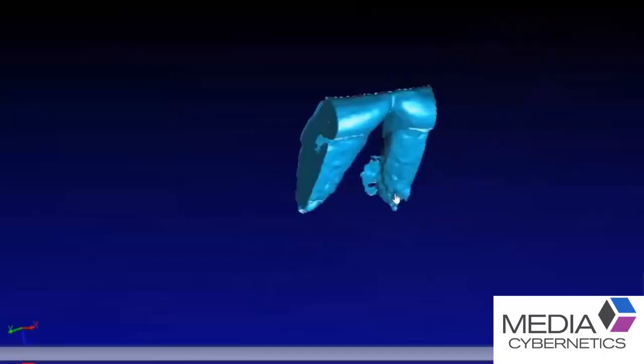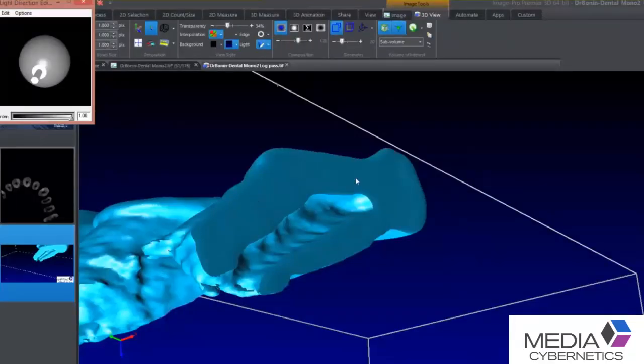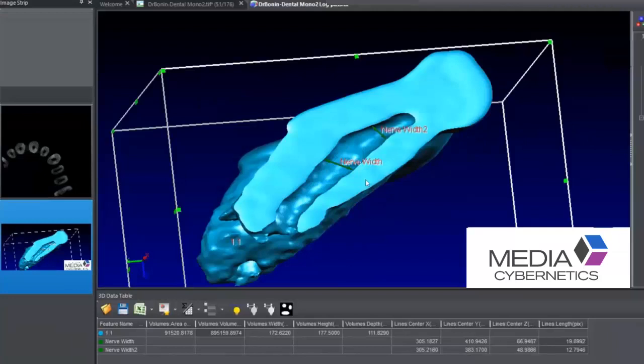In this perspective, where it ended up, now we're looking at it here. We can see this cross-section, and we did quite a bit of enhancement here to the light direction, the orientation, and the reflectivity. You can see that inside this cavity where the tooth nerve is, it provided a lot of detail about that inside cavity. That was accomplished by changing some of the lighting conditions that we have within the Image Pro 3D module.